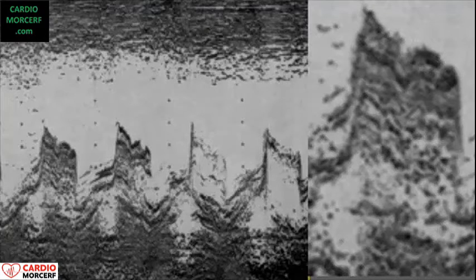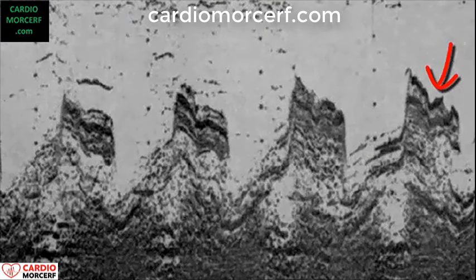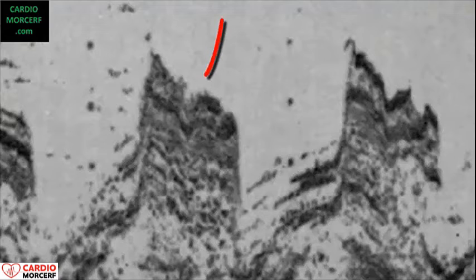Mitral valve with ruptured chordae and vegetation. Look at the erratic, chaotic movement of the ruptured chordae. It's a gross movement, different from the fine, sharp movement of the torn paper also seen in the enlarged view. Notice that there are no lines inside the smudge.